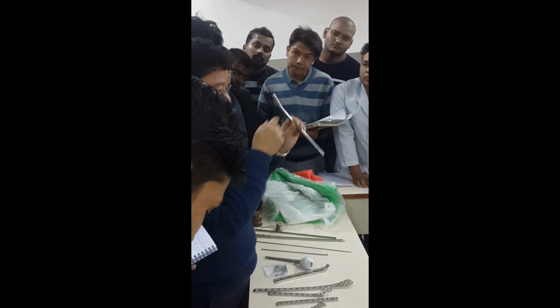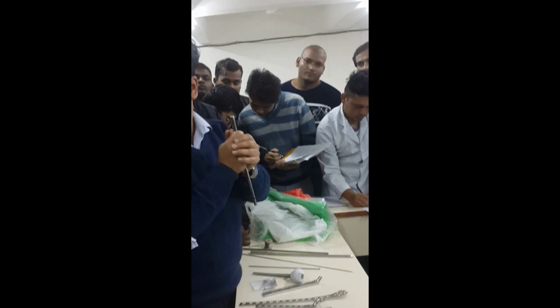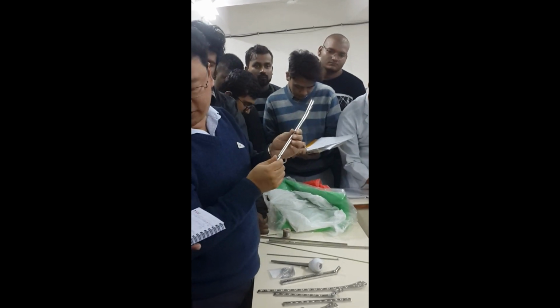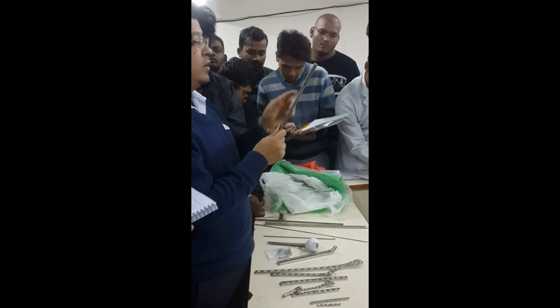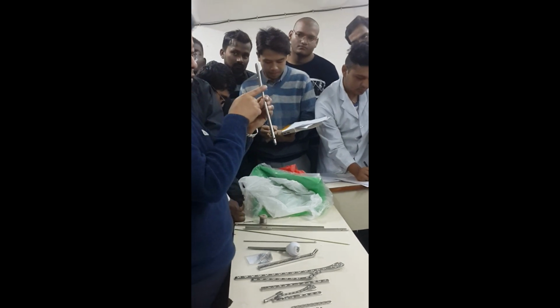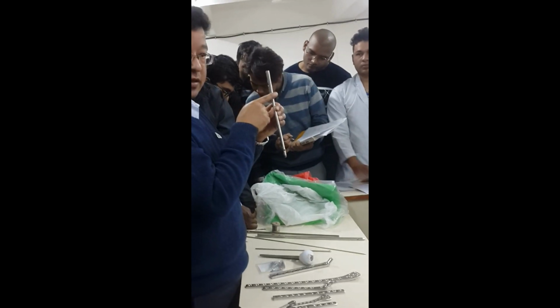It is for the insertion. You put this. Tibial angle 11 degrees, the tibial interlocking angle. If you get this, the examiner will ask you about this tibial interlocking angle. What is the name? What is the degree? And why is it present?